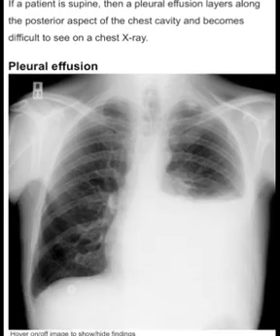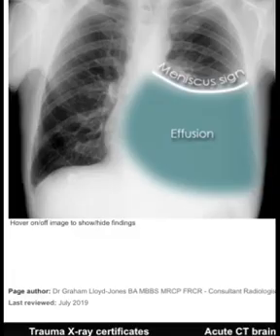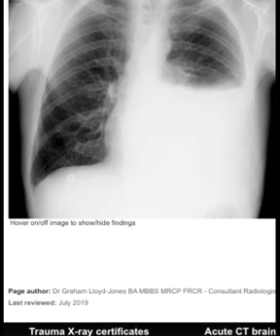Pleural effusion: the left lower zone is uniformly white, at the top of which white area there is a concave surface, meniscus sign. The left heart border, costophrenic angle, and hemidiaphragm are obscured. Slight blunting of the right costophrenic angle indicates a small pleural effusion on that side. Clinical information: lifelong smoker, weight loss and increasing shortness of breath. Diagnosis: large left pleural effusion, underlying bronchogenic carcinoma.